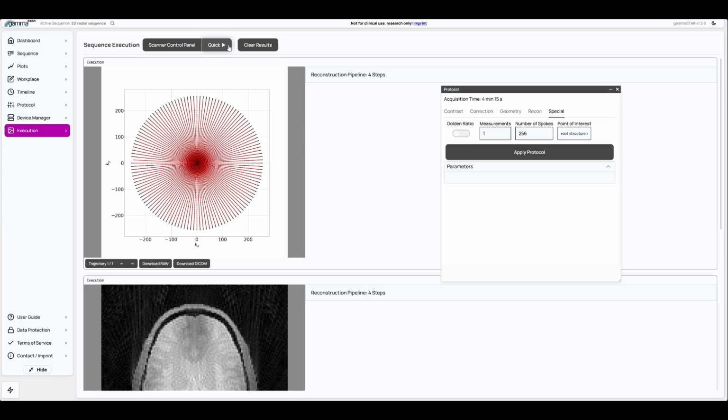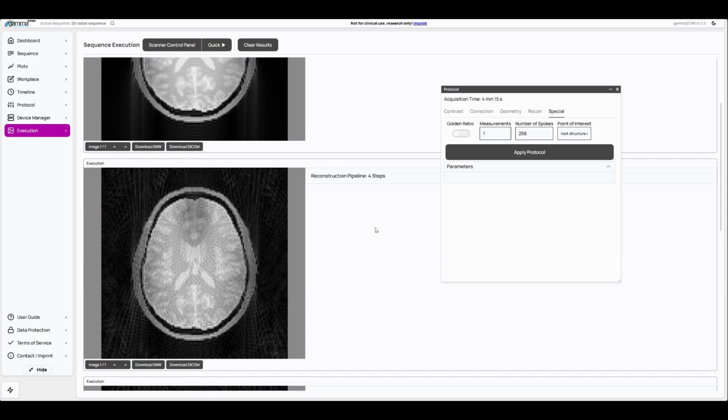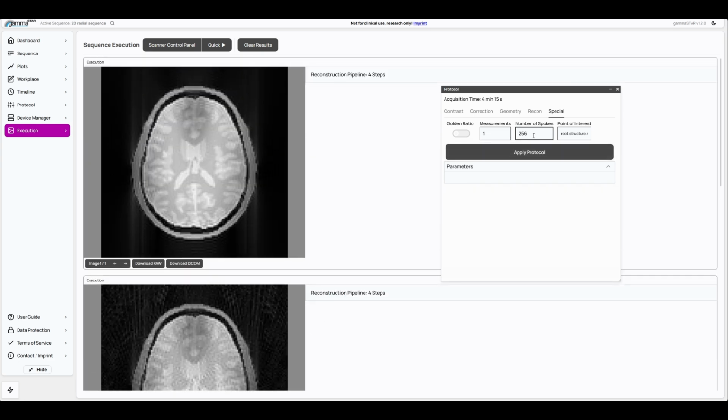to see how that affects image quality, because the thing is, if you have too few spokes, you would end up with quite large areas of k-space which were not sampled in these outer regions, which will also give you or increase these streaking artifacts which we saw before. So as you see, now we increase the number of spokes, so we have a more dense sampling pattern, or the more densely sampled outer regions in k-space, which improves the image quality quite a lot.